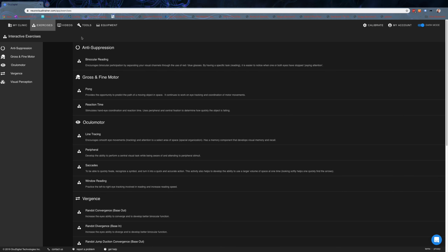So feel free, have a look, play around. There's some great stuff in there. And I know that the team is actually always adding more things too. They've been super responsive to us.